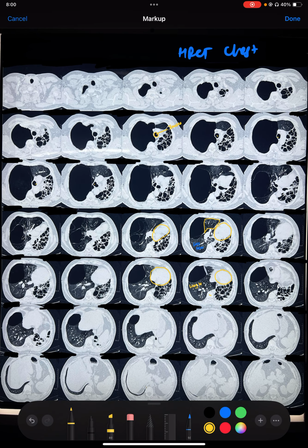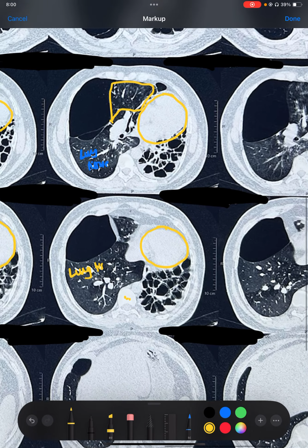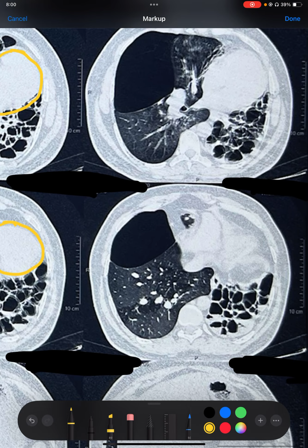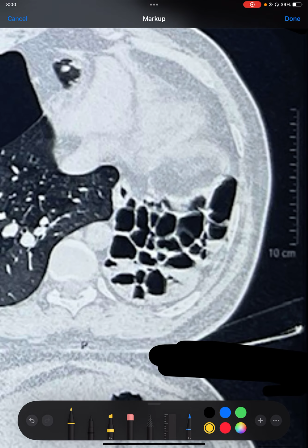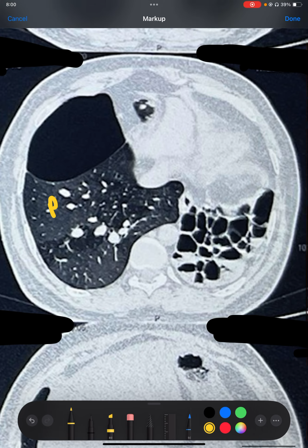Now there is a division into two main bronchi. This is going to the right lung, this is going to the left lung, this is left. This side is left and this side is right. So what is apparent is, when we discuss each and every lung, this is the right lung, which we can very easily and clearly notice.